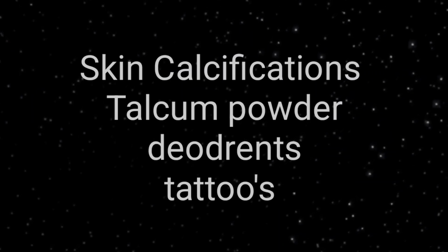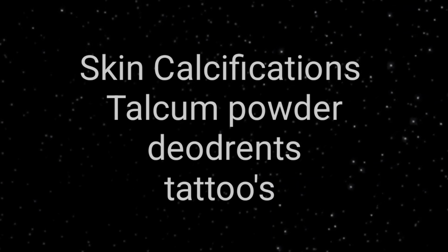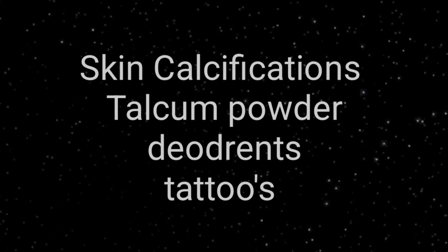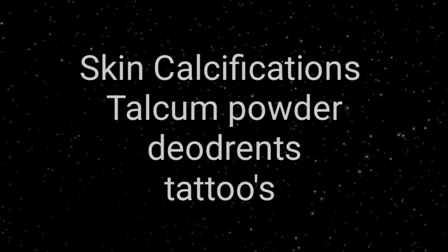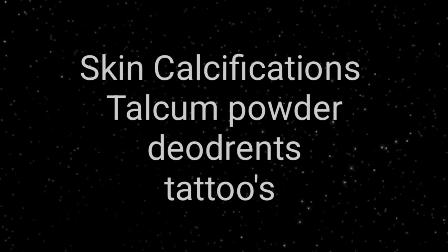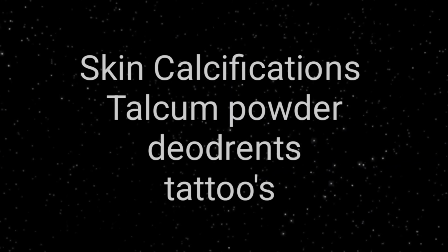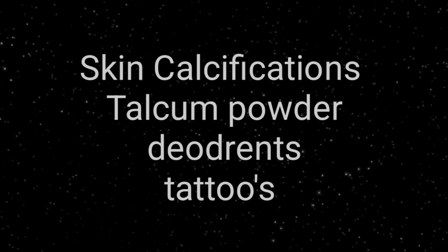There are a few other conditions in which you will be able to see calcifications, like in skin conditions there will be some skin calcification if someone is using deodorants, talcum powders, or they may have tattoos on their body, so it will mimic microcalcification. So one should be very careful about all these things, and especially at the time of mammography you should be very careful if the patient has any talcum powder on her body, or if there are any tattoos, as they may mimic microcalcifications.